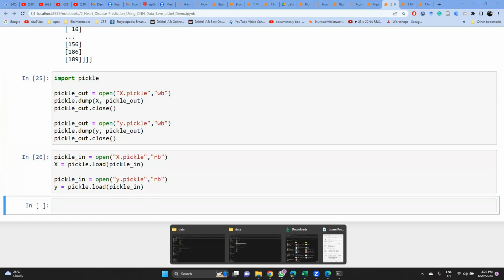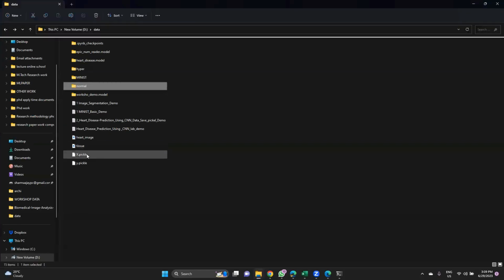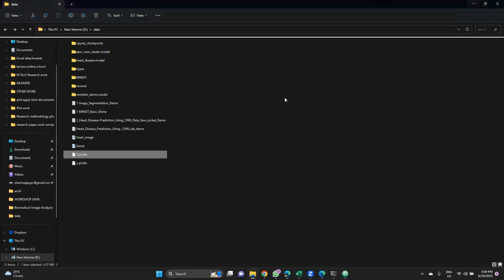So over here these values will generate an X and Y. In this way, our values are getting stored. We are not able to read them, but in this way the pickle value will be stored, and these values will be passed on to that particular backend, which will work on our mobile development application when we build up our model, and it will classify in a real-time scenario.